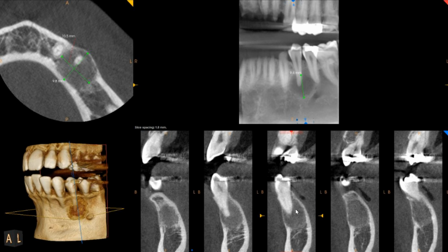So I really don't have much information. I don't know the patient's age. I don't know whether the patient is symptomatic or not. But looking at this, I don't think there's any major occlusal restoration. If any, this might be just artifact coming from this distal restoration. So no major occlusal or coronal restoration. So I'm going to presume that this patient is going to be asymptomatic, so an asymptomatic vital tooth with this area.